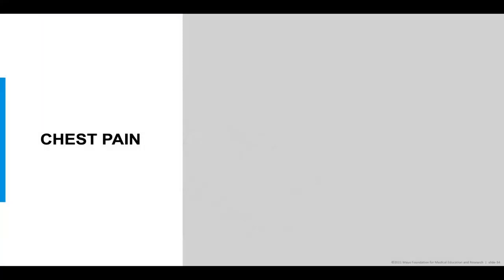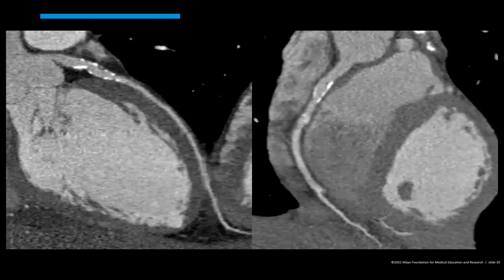And we have, sorry, one more question in this slew here. Any advice on telling positive remodeling and coronary artery aneurysm apart? So in this coronary artery aneurysm, there's no thrombus, it's all lumen, it's enhancing. Whereas in positive remodeling, the lumen is either going to be normal in caliber or it will be narrowed. Does that make sense? Yes, thank you.